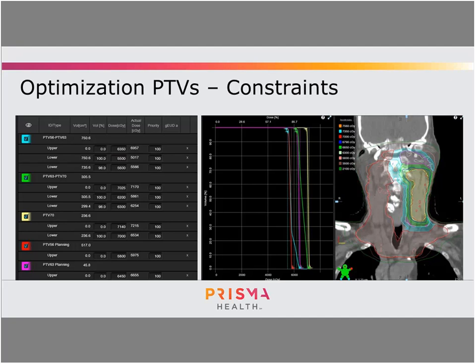And then over here, I pulled up a screenshot of what this would actually look like in an optimizer. So I'm trying to give some very specific examples of what I would do on these to hopefully convey that. So let me pull up this laser pointer here and walk through this.